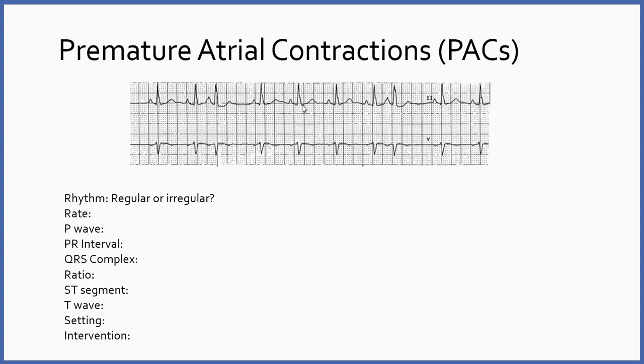Let's find the ST segment. Notice that the ST segment is pretty isoelectric except for here, but this is the early beat, so I'm going to come back to this. I'm going to ignore this for now. ST segment here, here. So the ST segment looks fairly isoelectric except for the early beats. So for the underlying rhythm, I can say that the ST segment looks okay.